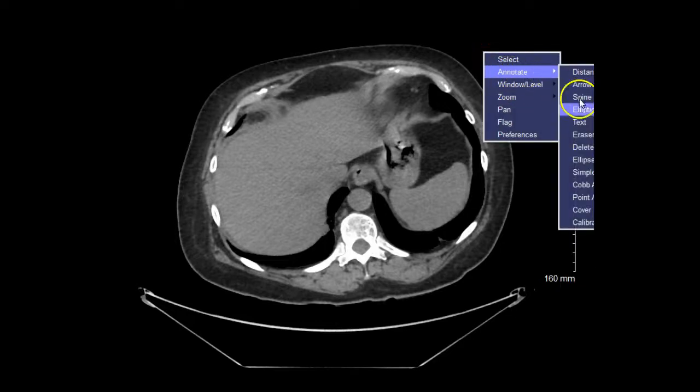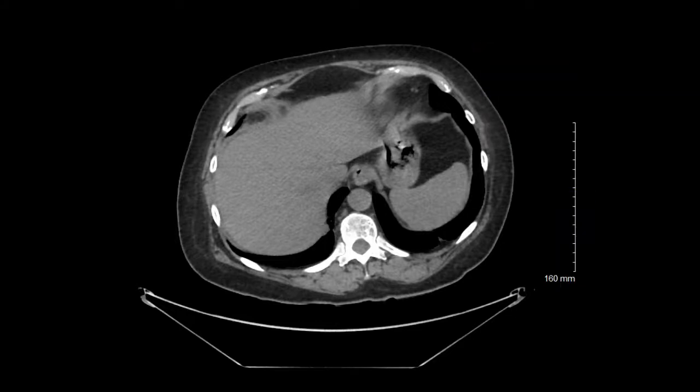So when we look to annotate these, what I'll show you first is a point analysis. Basically when I select a given point, it'll report out an HU. So in terms of predicting things, we know that fat based on an HU table is a negative value. When I click on here, you can see that that particular area does indeed have a negative HU value, in this case, negative 111.